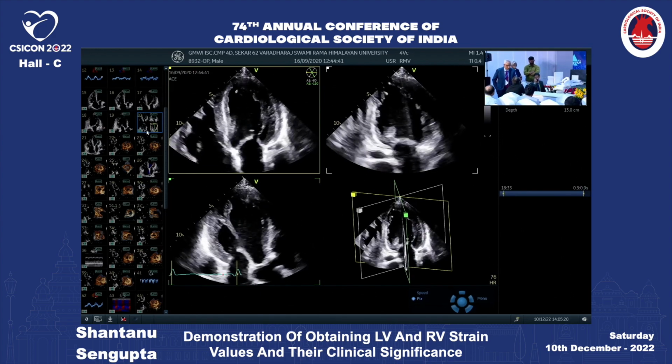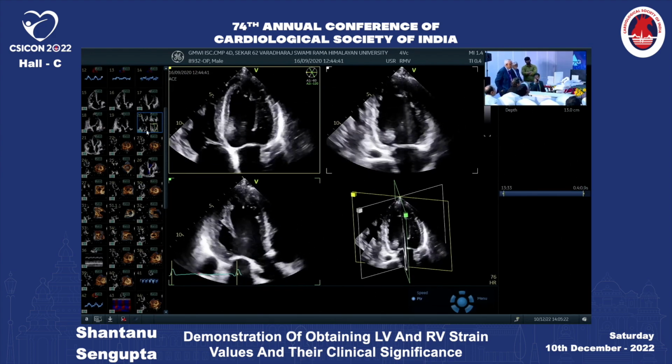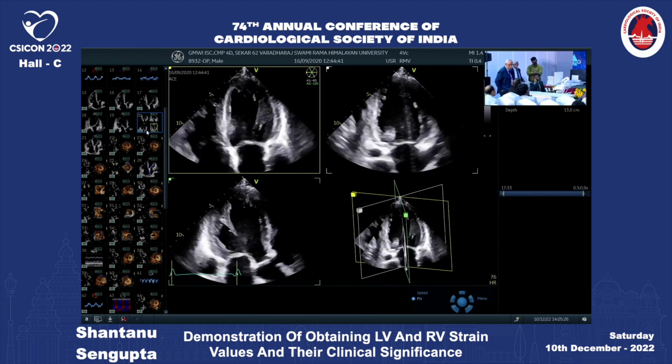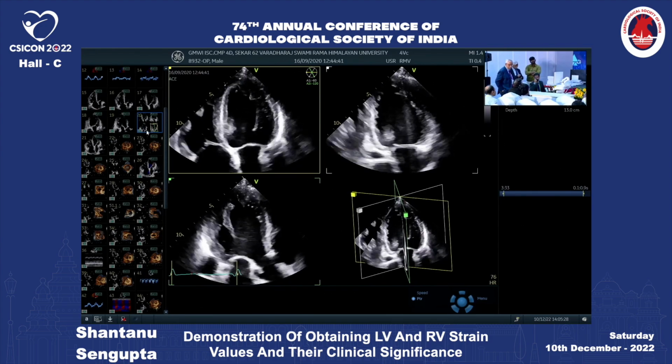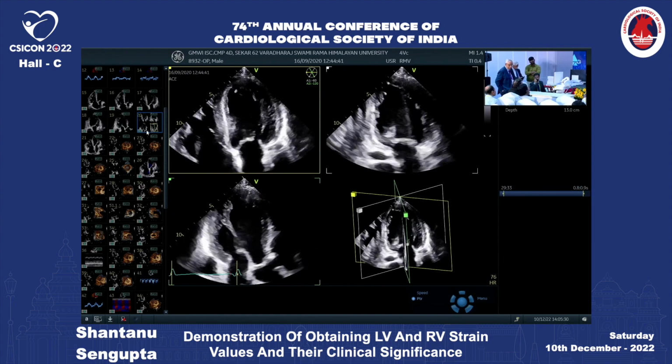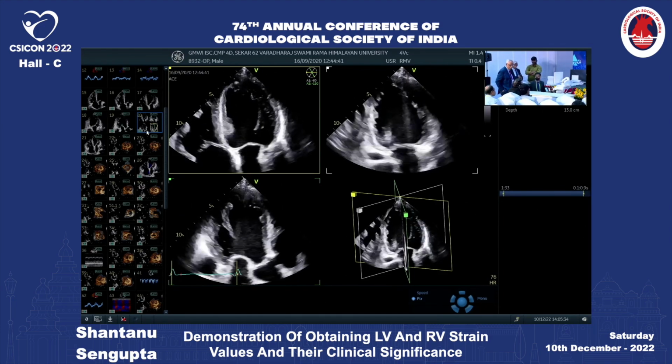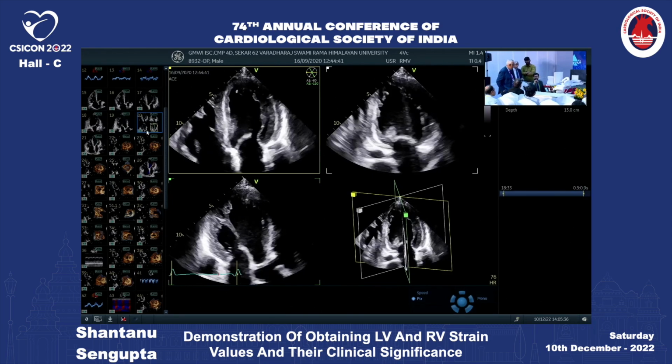So one very common and practical question. Echocardiographically, left ventricle ejection fraction is 60, but when we compute the GLS, it's about 12 or 10. How should we report it? Because the person will become hypochondriac if we say that this is... It is an important thing.